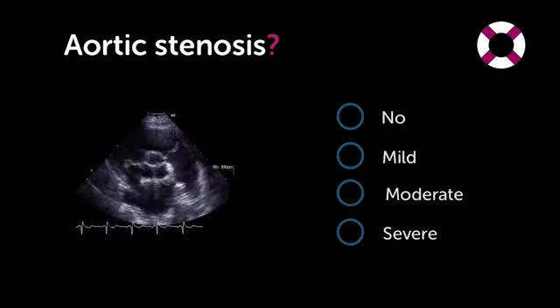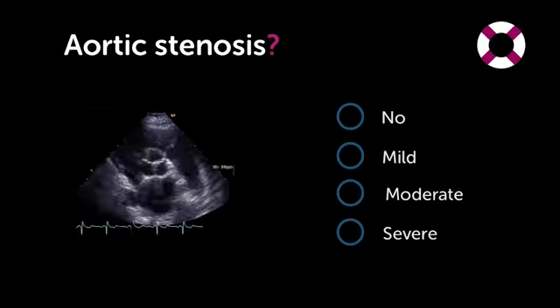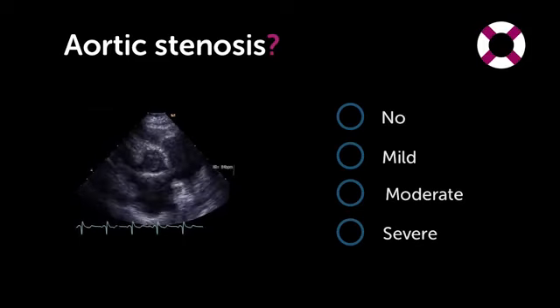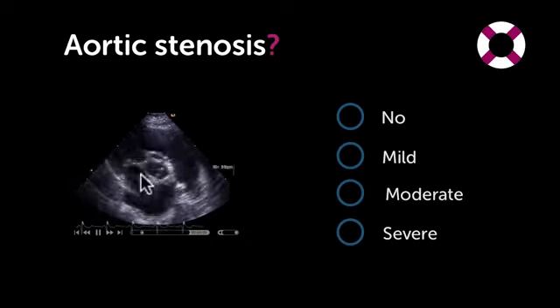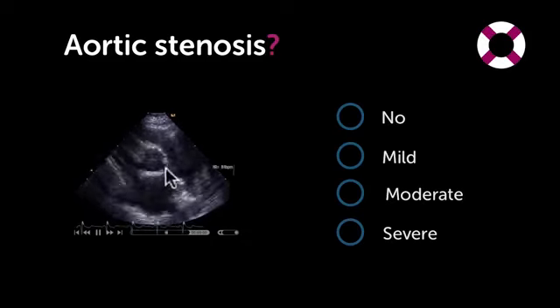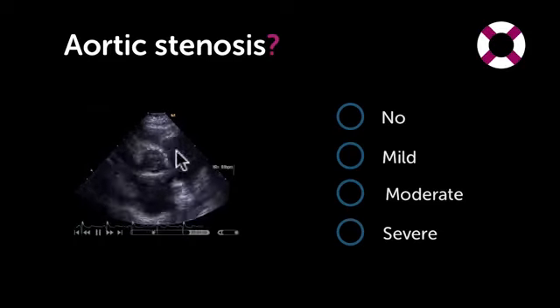Next case. What about this valve? Do you see calcification? How does the valve open? I believe there is just a bit of calcification. It's more that the surfaces of the valve are thickened, but there is a bit of reduced opening.